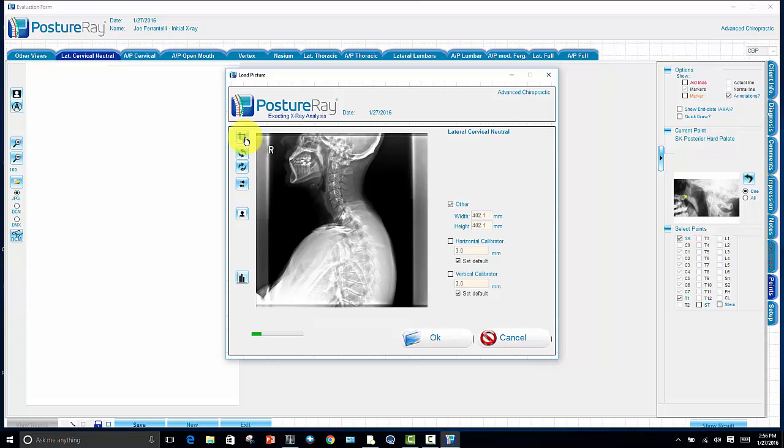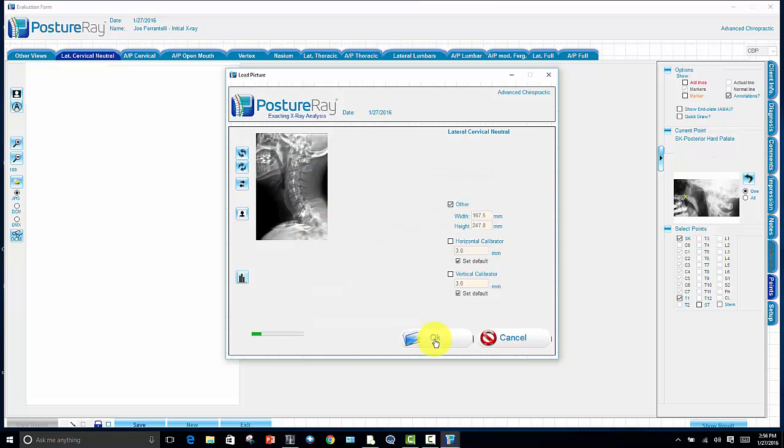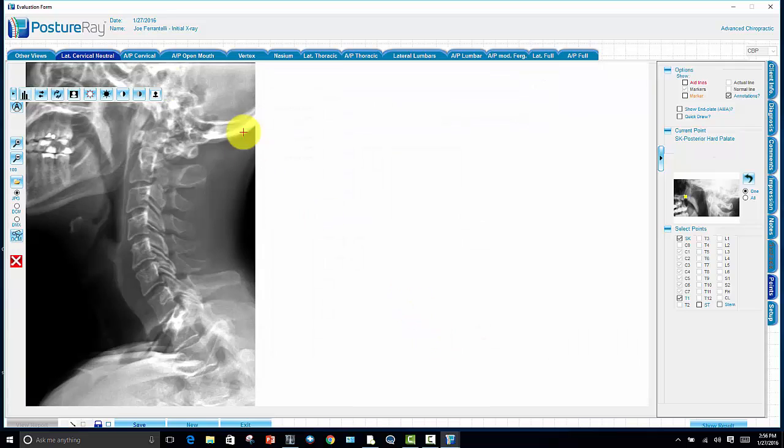And the doctors always ask me questions on this. Wait until we get to the training to ask those questions, okay? And we will explain those in detail, the reasons why we do this. Basically, you have to predefine an order that we click. And the computer has to know what point is next. That's the easy reason.